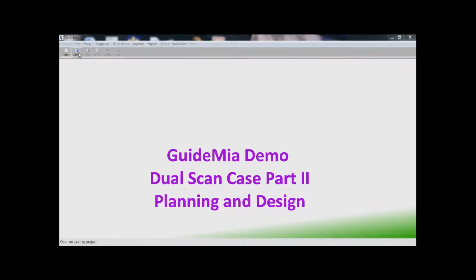In the second part of this demo, we will open the project, place 2 implants, generate a surgical guide, export the STL file, and then generate a treatment plan. We will only demo the basic features in this workflow and also mention some additional features. First, we open the project we saved.